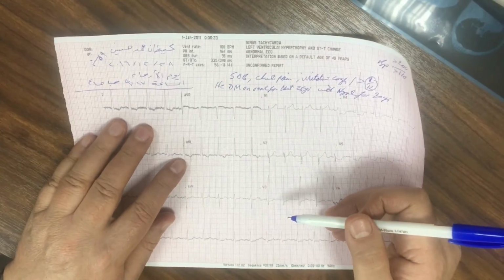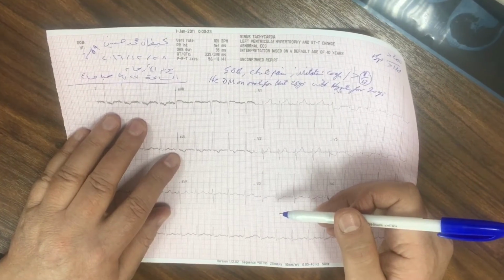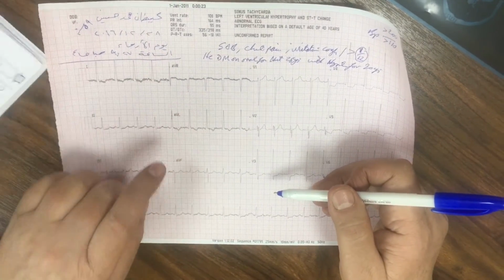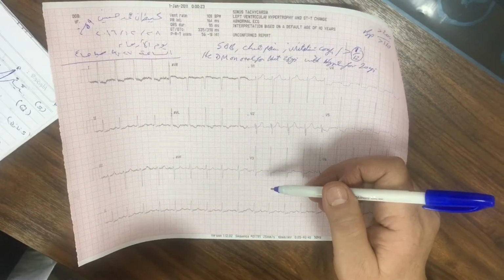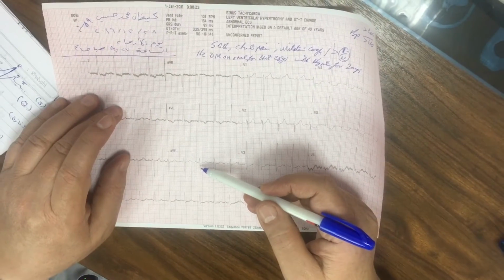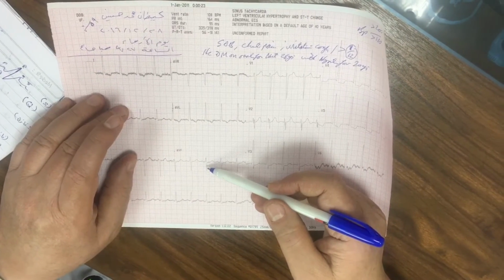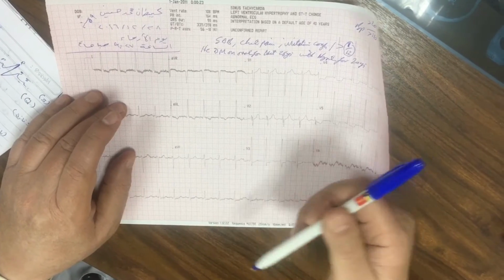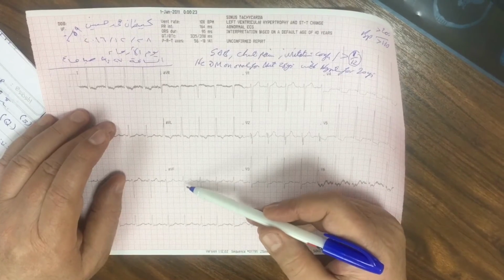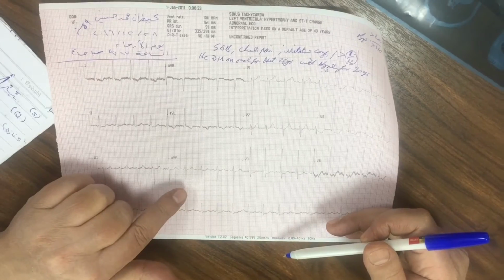Therefore, this can lead to a diagnosis that this patient got what? LVH. Okay? And therefore, a high R in AVL more than 11 small squares means LVH. The second one, if you get a high R in AVF more than 20, it is also good. Go with LVH. Any one of these can lead to diagnosis. There is a small R wave, but there is deep S in AVF. Okay, we get nothing from AVF.